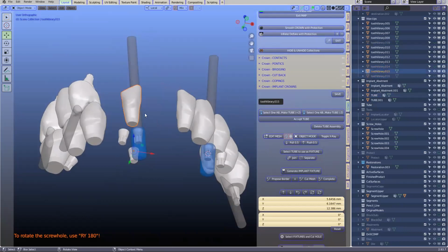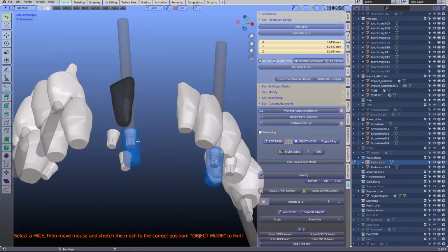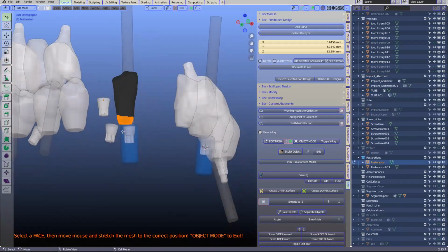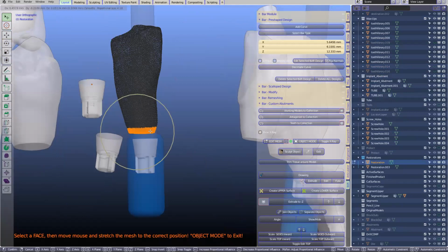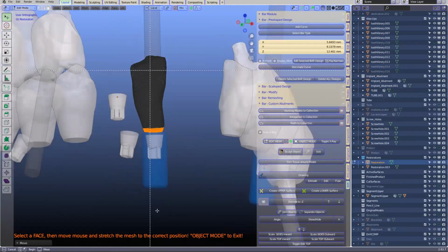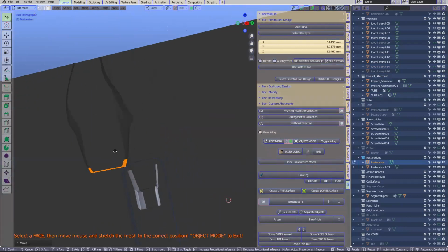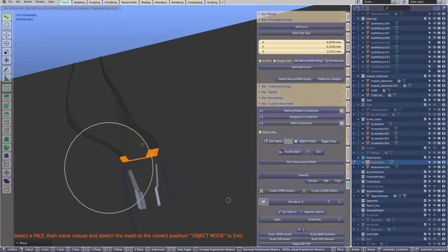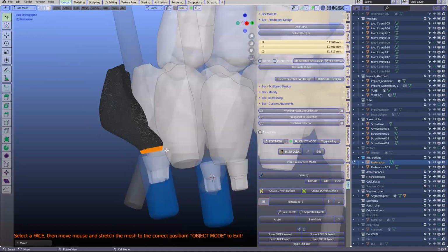In the bar module, I'm going to remesh this tooth, edit that, go into transparent, the C key, take that. Actually, that's a little bit much, like this. Use the G key. What I'm going to do is I'm going to go Alt B. Now you can go Alt B even when you're in edit mode. Some of you guys may not know that. So Alt B will always work. Doesn't matter what mode you are using. It won't work if you're on TeamViewer, Michael, because Alt B conflicts with the TeamViewer shortcut keys. Does it? Damn, I didn't know that.